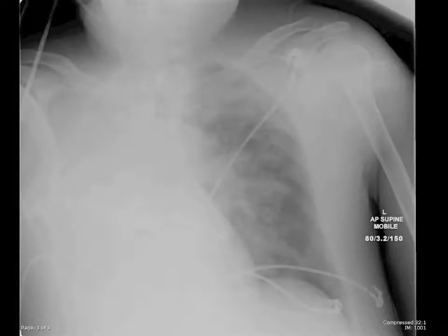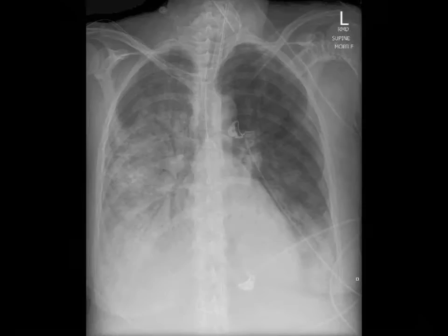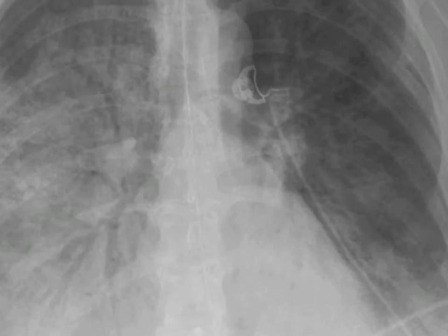The position of the mediastinum can also assist. In collapse, there should be a shift towards the area of whiteness, whilst sudden massive fluid collections will push the mediastinum away. Total lung whiteout from consolidation is unusual. The mediastinum would be expected to stay in the midline, and air bronchograms should be visible.